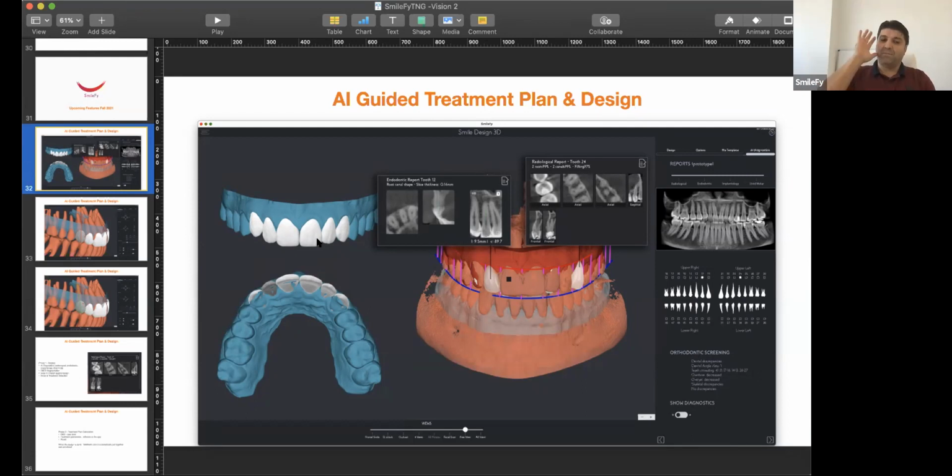And you have a better overview in the same period of time, like you have in the design. So you have the overview of the biological condition. You can make the decisions about the treatment. You can add notes. You can explain to the patient, but also show visually. That's the most important part of communication. You can visually communicate what's the problem with the situation, with the condition.